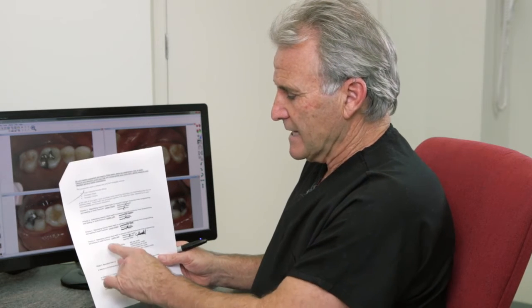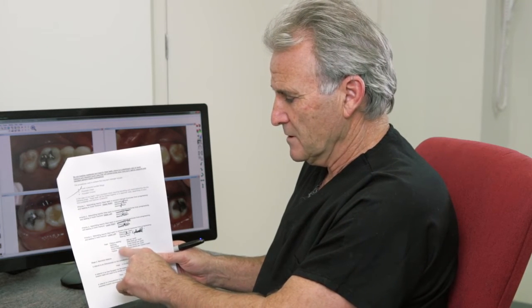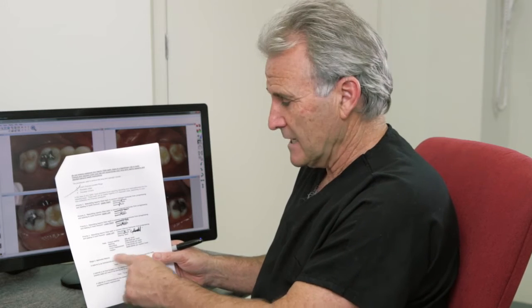The template has a costing structure which you can put in your own costings. You've got fissure sealing, refilling, rebuilding, sometimes crown replacement and implants. And if any of these are not to be used, simply remove them from there.